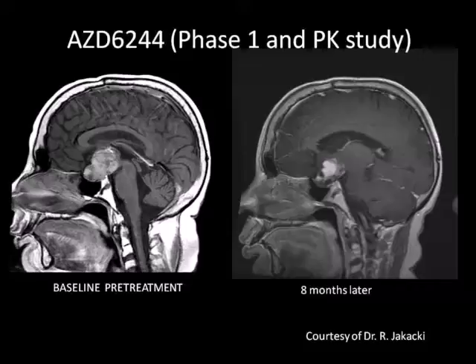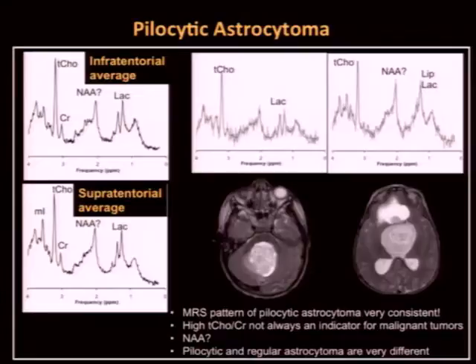And I'm just going to show an example that Dr. Jakak, one of our oncologists, gave us of some of the responses that we are seeing. And this is something I think we're going to see more of that has been very promising. What's been interesting about it, there are some new challenges because there's residual non-enhancing tumor left, and it's not always clear exactly how to understand if the tumor is still responding or not. So I think while this is very exciting, we're going to see some new neuroimaging challenges emerge from this in the future. So definitely keep an eye out for this.